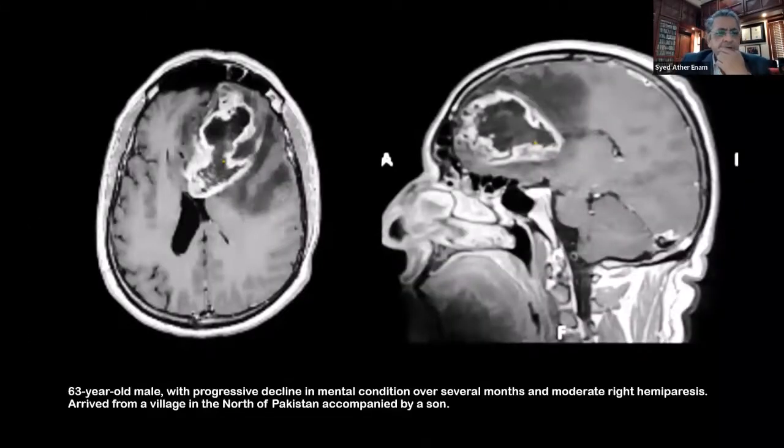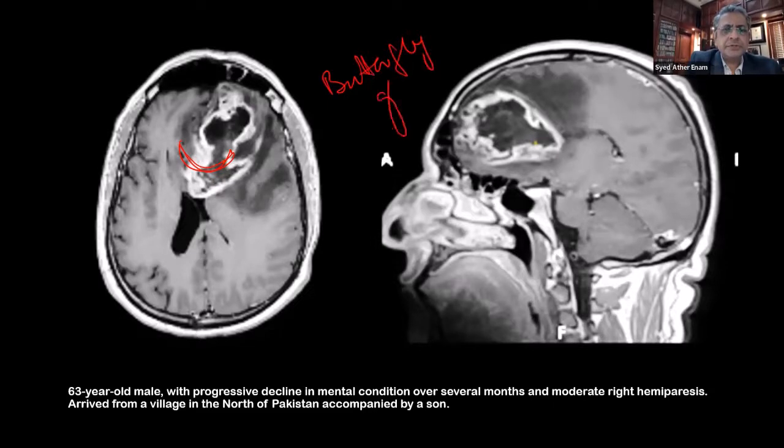Now here, think about it. This is a 63-year-old male with progressive decline. This is a contrast enhancing image, and this is all contrast enhancement over here. So it looks like a GBM, right? Now remember, GBM typically will cross the midline. Not typically. So those tumors which cross the midline, and the word used butterfly glioma, which is not used so frequently now.